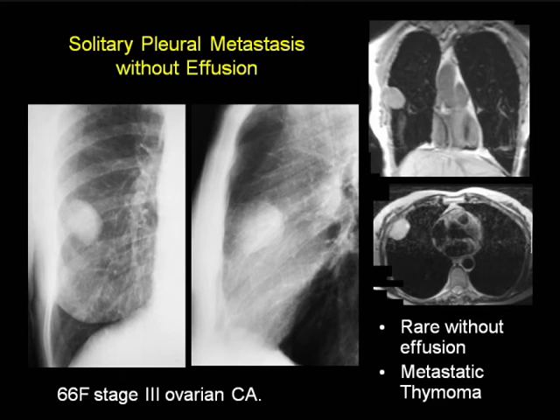You're going to see a pleural effusion on chest x-rays, and on CTs you'll see the mass embedded in the pleural fluid. Can anyone tell me what the one tumor is that characteristically gives you pleural masses without effusions? We saw it this morning.